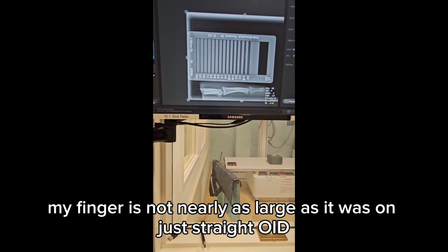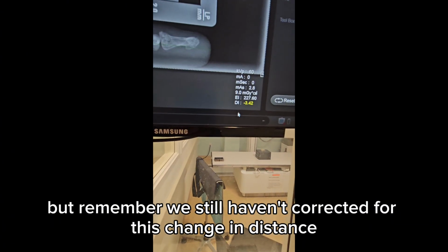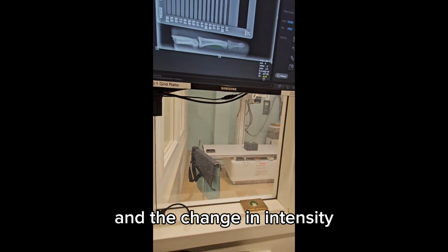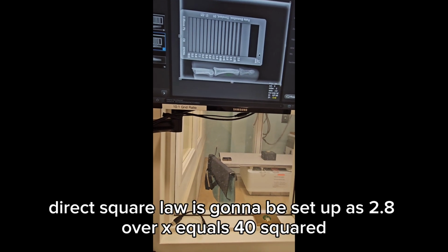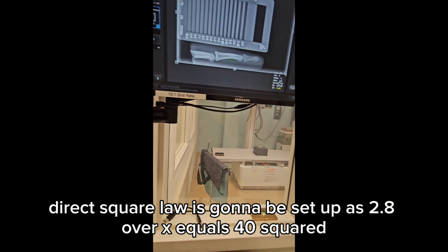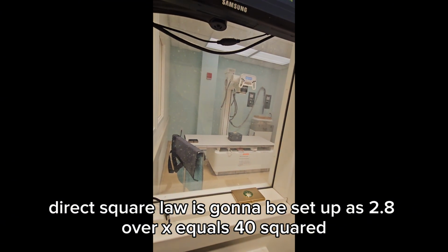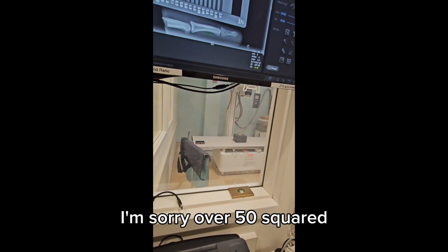My finger is not nearly as large as it was on just straight OID, but remember, we still haven't corrected for this change in distance and the change in intensity. So that's when we do direct square law. So direct square law is going to be set up as 2.8 over x equals 40 squared over, I'm sorry, over 50 squared.